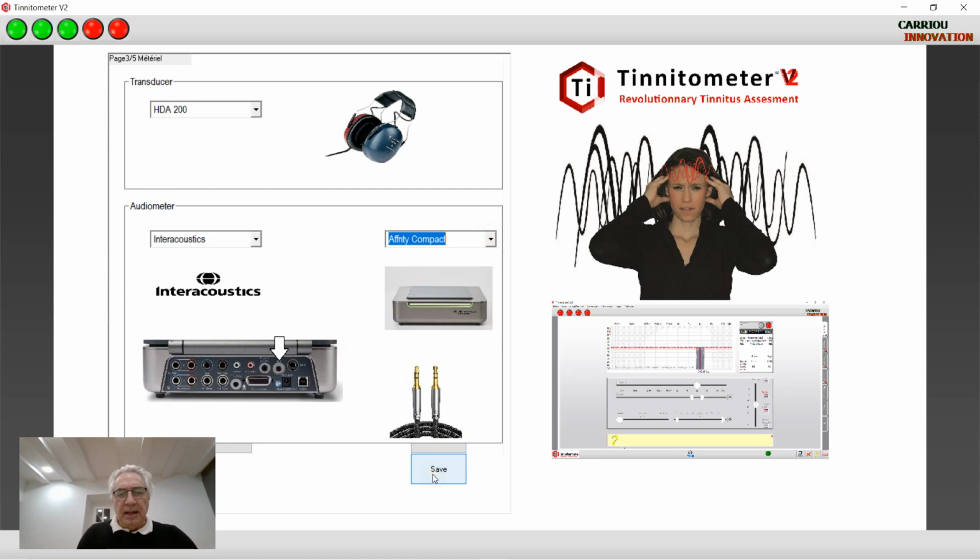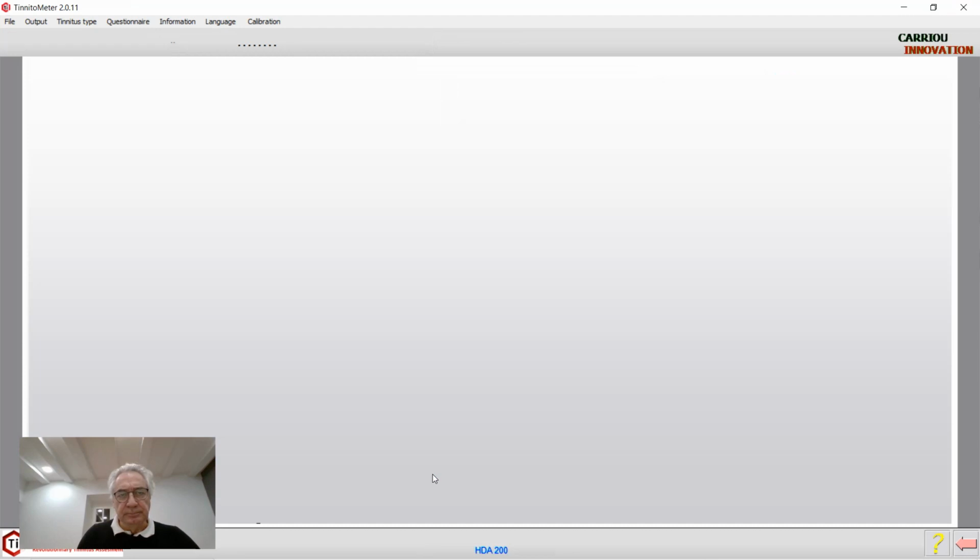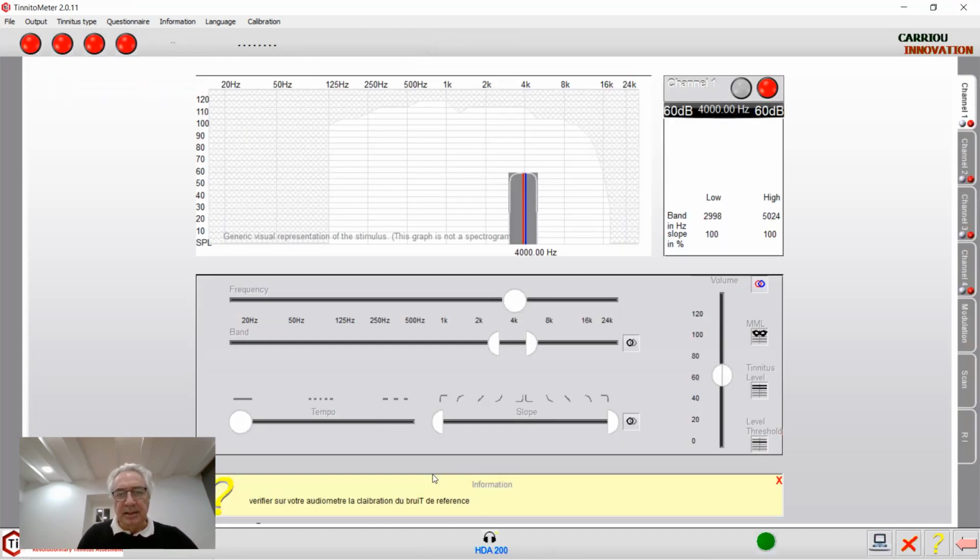Okay, after that, you send the information to the server and it gives you back the right to go to your evaluation version. And that's it. You can begin to run and it works.